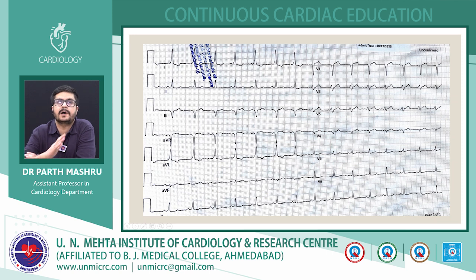So most likely the pathway is on the right side, but in the middle, on the septal area. Then we see leads 2, 3 and AVF. Lead 2 is not negative, but AVF is biphasic and 3 is negative. So it is on the posterior side, but not likely on the epicardial region, because lead 2 is positive. So this is most likely on the right posterior septal area or right inferior septal area.